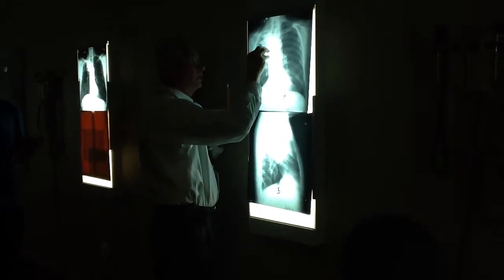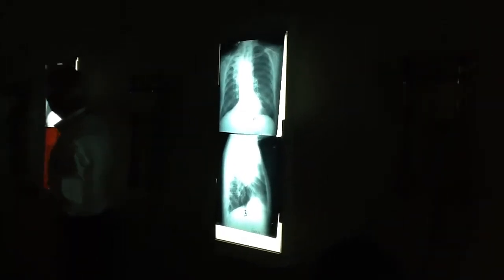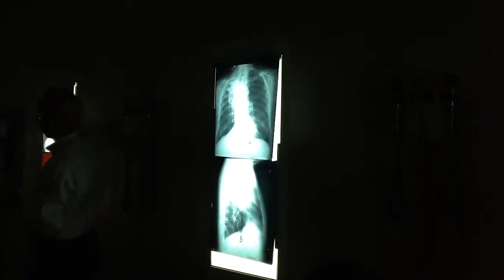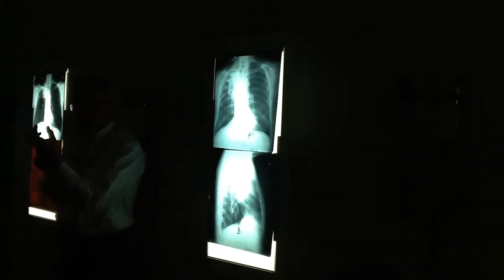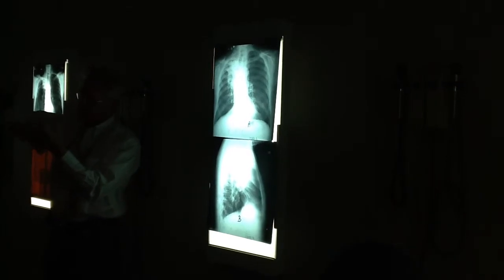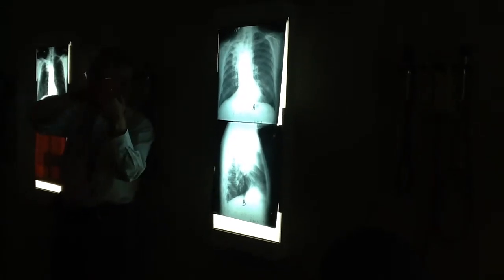But the tumor has sufficient bulk in the hilus. It's like if this one kind of grew out this way instead of this way. If it grew this way, or even maybe a little bit anterior, as the fissure starts to go up, the medial part of the fissure kind of bangs into the tumor, and it can't push the tumor out of the way.